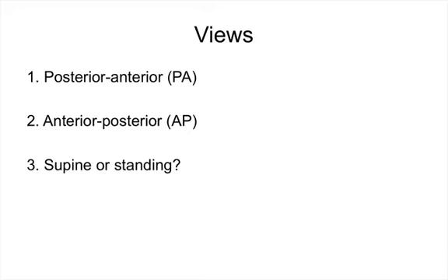Note, however, that the size of the heart cannot be commented on, as the AP view exaggerates the heart size. It's also important to note if the X-ray has been taken with the patient supine or standing, as this will affect the distribution of any pathological air or fluid.